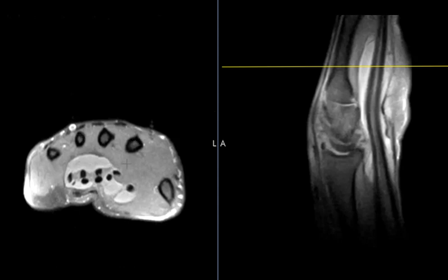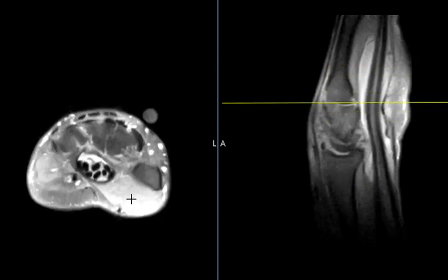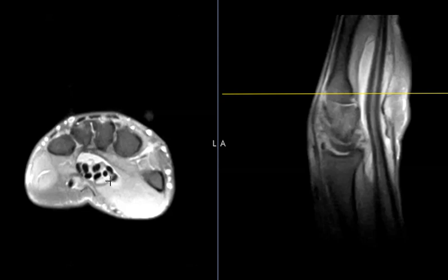And that's it. So inflammation of the palmar bursa, again, these 2 main bursa, and also the flexor tendon sheaths of these 3 are the 3 main components. And these 2 usually communicate with each other at the level of the carpal tunnel here, and often they're so large it's hard to appreciate the communication, but it looks like it may be right here where these two communicate. Right there, there's that tiny little communication in the channel, and here's the other fluid collection.